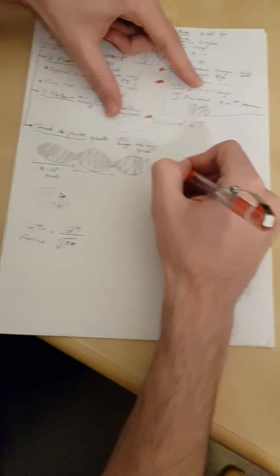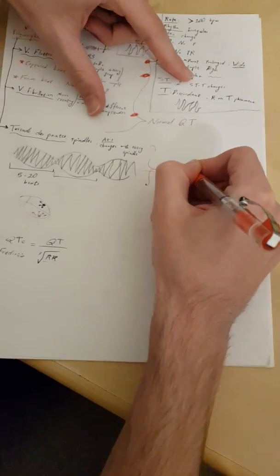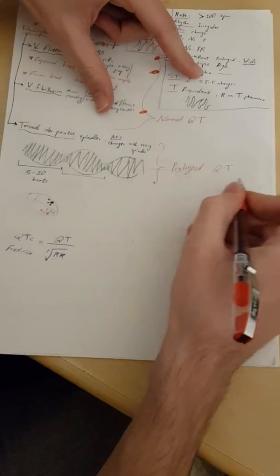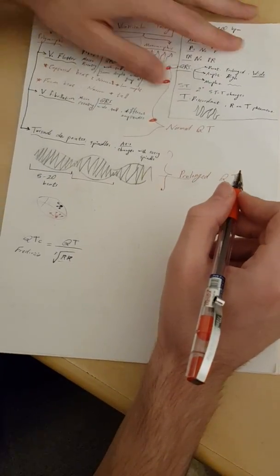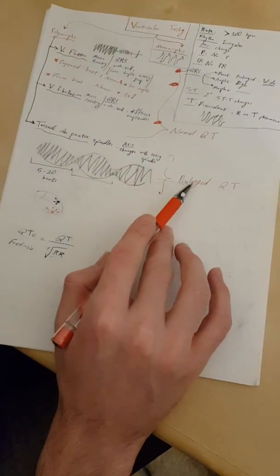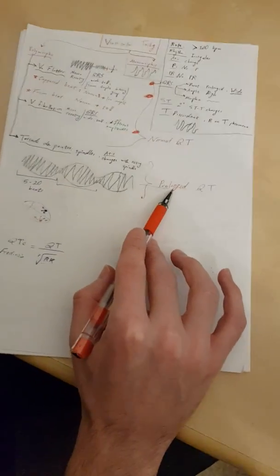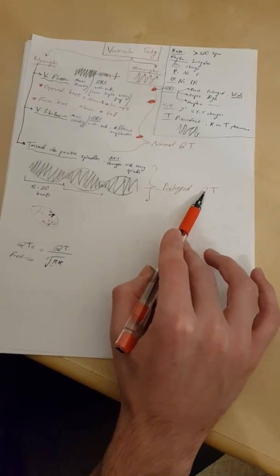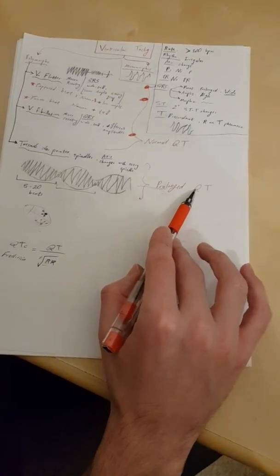So in this one, we have a prolonged QT, and that's a difference. How do we know this? Also by research. Why is this difference very important? Because when you have torsade de pointes, it means you should know on your own that this one has a prolonged QT and you need to correct the QT. How can we correct the QT?